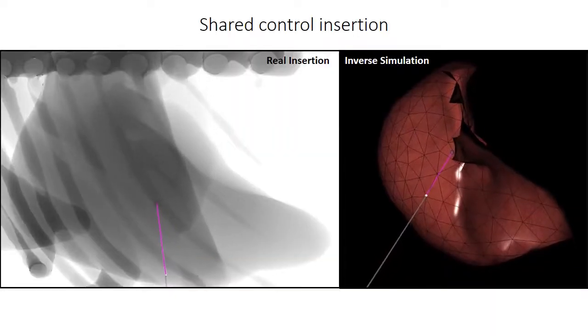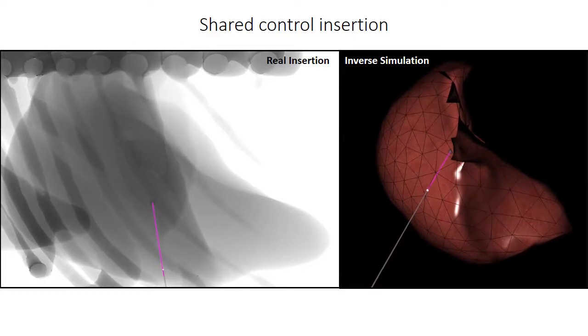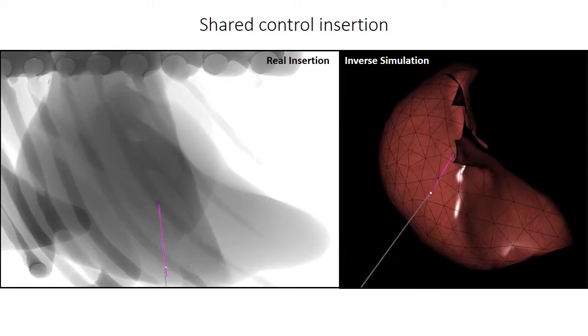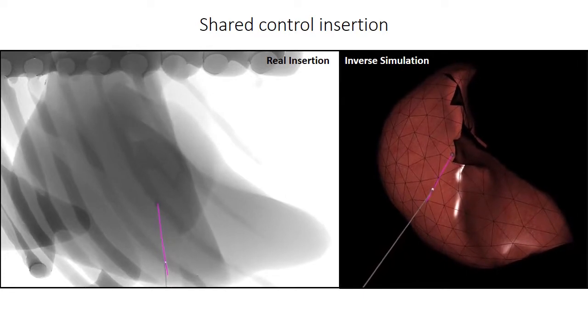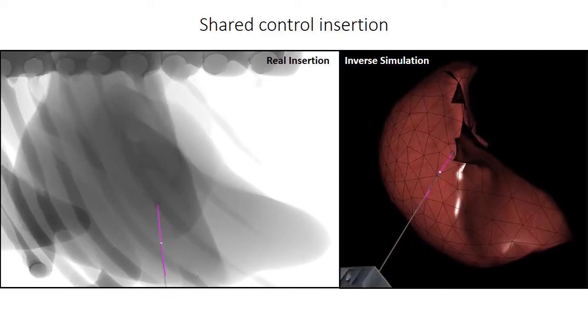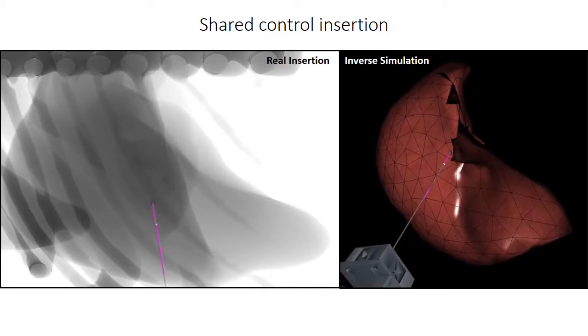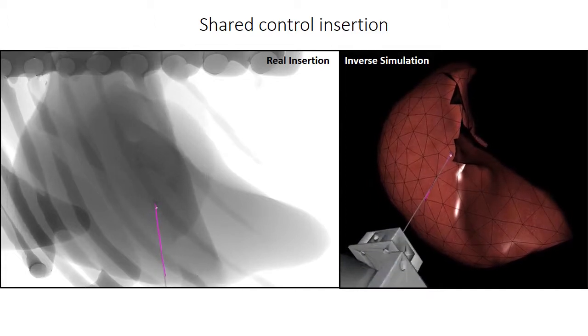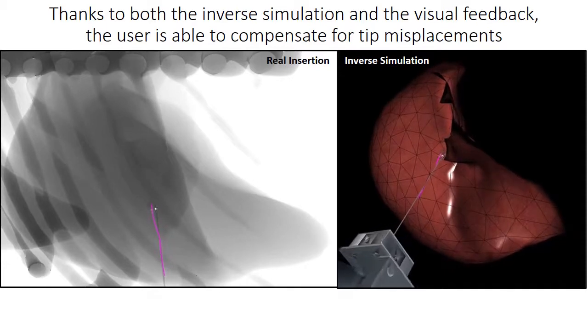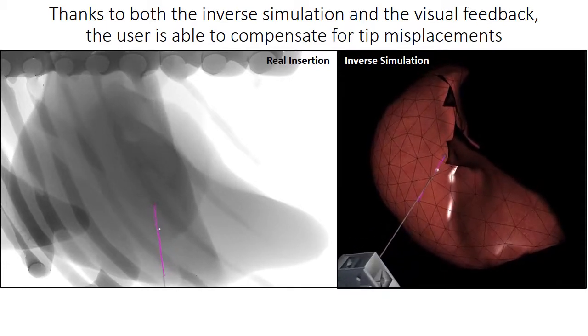Here is a demonstration of a needle insertion performed using our method on the virtual patient. Thanks to both the inverse simulation and the visual feedback, the user is able to compensate for tip misplacement.